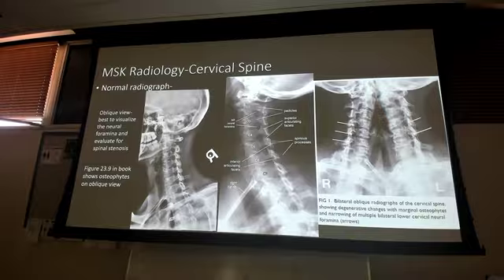That can cause some significant radiculopathy and pain because the nerves and the vessels roll through there. And so when you get these osteophytes or this kind of inflammation going on in here, it rubs up against those nerves and can cause some neuropathic pain. We'll see other pictures with really bad ones so you get an idea. We don't order obliques too often, but this is the best view to look for those osteophytes or that arthritis of the cervical spine if you're concerned about that.